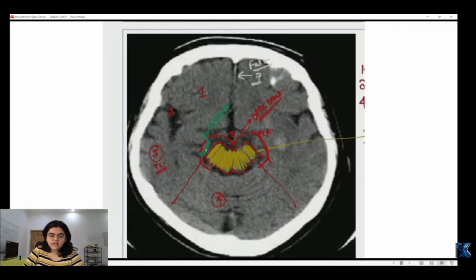Now here, in this image, you can see the midbrain at the level of inferior colliculi. ठीक है. So midbrain at the level of inferior colliculi, here you have the basilar artery dividing into posterior cerebral artery, then this is the optic tract that is there in front, then here you have the falx cerebri, frontal lobe, this is sylvian fissure that is situated between the frontal lobe as well as the temporal lobe, and here you can see the foliar architecture that is of cerebellum.